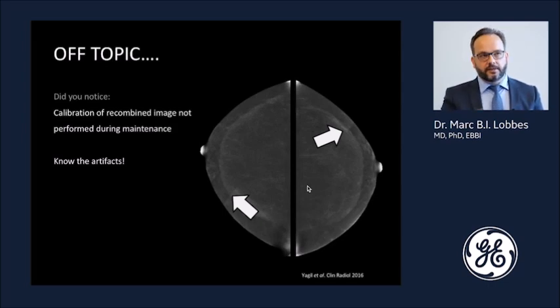So again, the take-home message for this case is to learn to know the artifacts that are common in contrast-enhanced mammography, and if you know them and you are experienced with them, they shouldn't be any cause for diagnostic dilemmas, but also know the artifacts which are not associated with contrast-enhanced mammography, and which should be a cause to consult your technicians to see how to solve this problem.